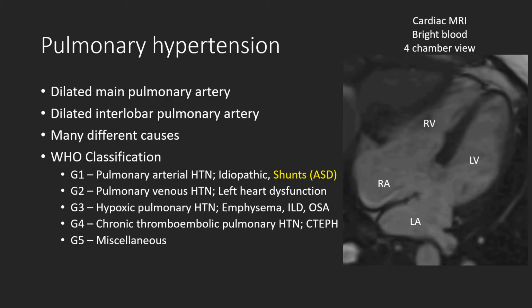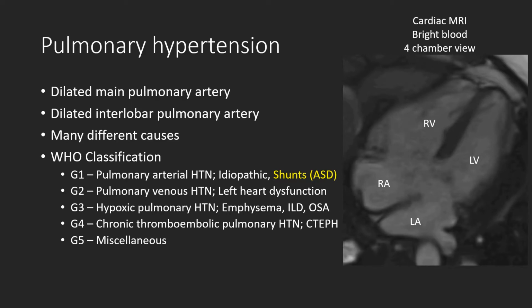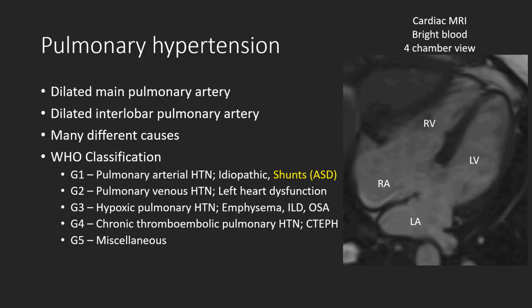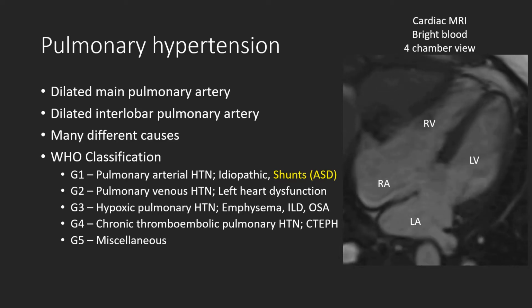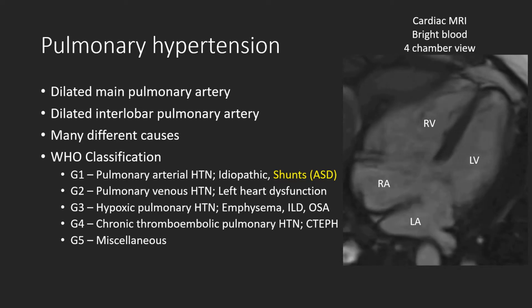Cardiac MRI also allows us to watch the heart contract in real time, where we can see swirling of blood between the 2 atrial chambers through the large atrial septal defect that was previously noted with the blue star.